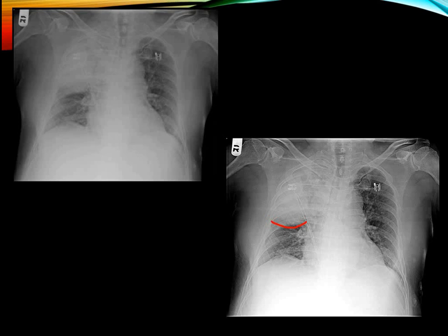Of course, this chest X-ray shows also a patchy opacification in the right upper lung zone, limited inferiorly by the horizontal fissure. But the shape of the fissure is displaced inferiorly due to increase of the volume of the right upper lobe. And this increase of the volume is caused by a special type of pneumonia, which is called Friedlander's pneumonia, caused by a specific organism like Klebsiella pneumoniae. These organisms are pus forming. The pus will increase the size of the lobe, and it will result in the bulging fissure sign.